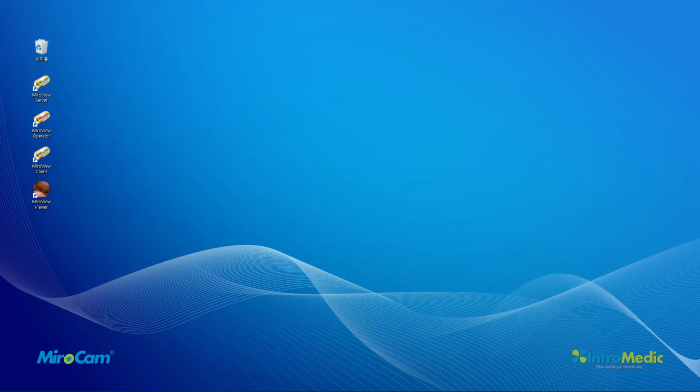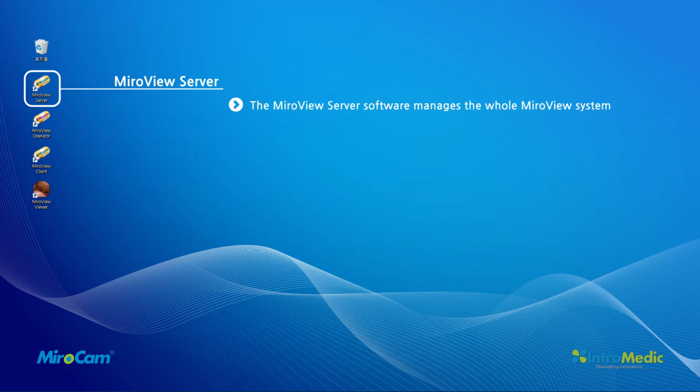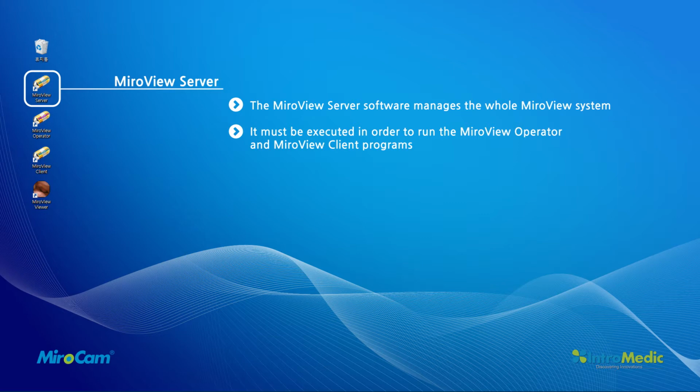MiroView 3 software package is composed of MiroView Server, MiroView Operator, and MiroView Client. First, the MiroView Server software manages the whole MiroView system. It must be executed in order to run the MiroView Operator and MiroView Client programs. It manages the file system and the database and stores patient files.